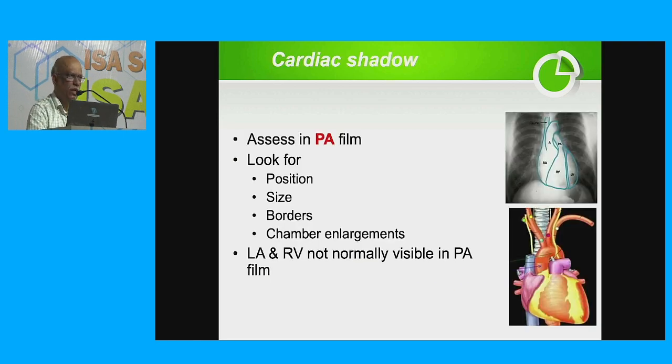So I'll go organ-wise. As an anesthesiologist, I go with the important ones: the trachea, air shadows, then cardiac shadows. The examiners, in examination as well as the clinical scenarios, the cardiac shadow we should correlate with the clinical finding. For example, if a patient is having long-standing hypertension, you look for a cardiomegaly. If a patient is having mitral stenosis, you look for features of mitral stenosis. So you should know. And examiners are fond of so many questions on the cardiac shadow.